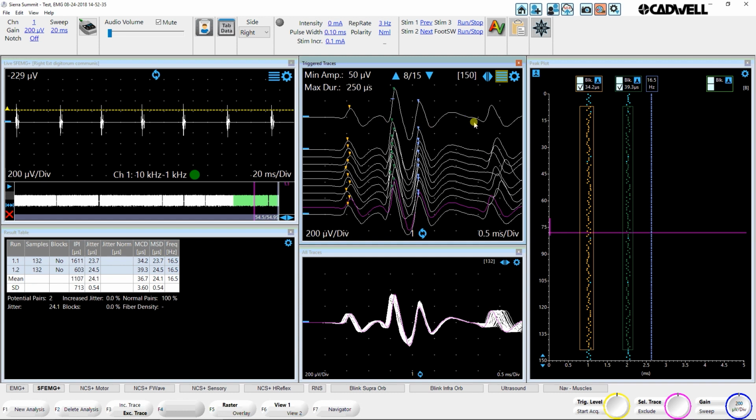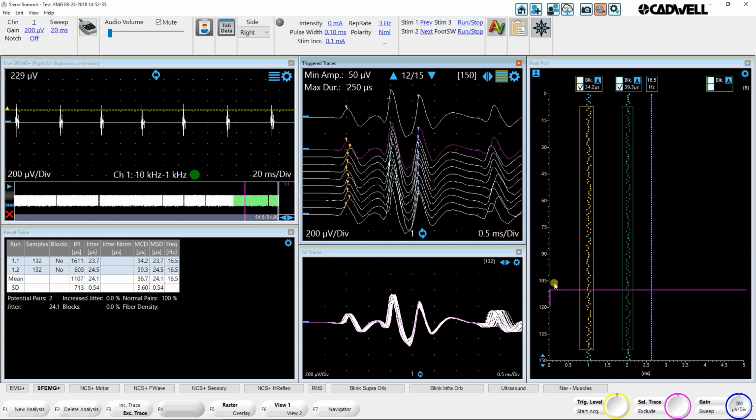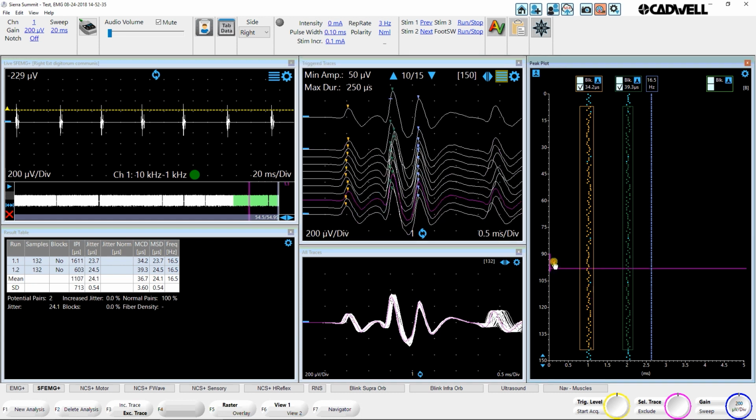The top trace here is the purple line. That's the one I'm on. And this is all the traces in that page. So I'm seeing a page here. I'm looking at about the second to the bottom page. This purple one is the top trace here. So I can quickly either drag through here or drag through here to see those.